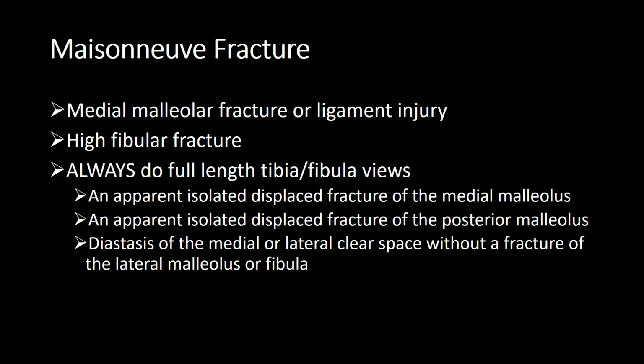With our previous case that we looked at, we had diastasis of the medial clear space, but no evidence of a fracture. So we had a medial ligamentous injury, and then that high fibular fracture. And sometimes that high fibular fracture can be as high as the fibular neck.